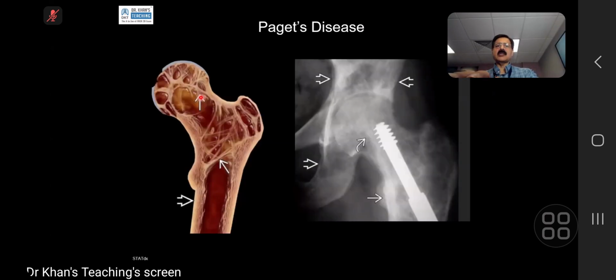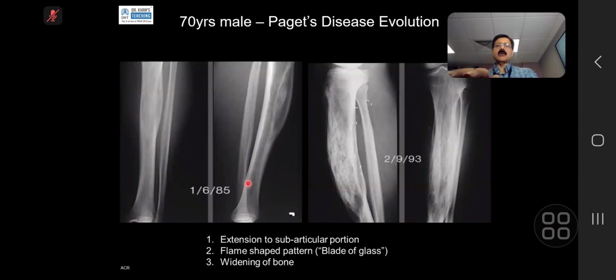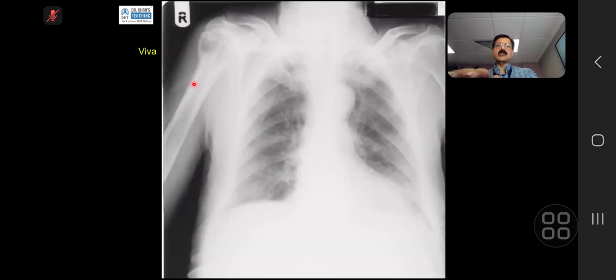just like your case here, there is a bit of lucency, which is explainable on grounds of the normal pathophysiology of Paget's disease. But the way you tackle it was absolutely fine. So it is what we call a pseudo finding. You remember today I showed you a case of rickets in which there was a pseudo finding of periosteal reaction. So this is something like that.